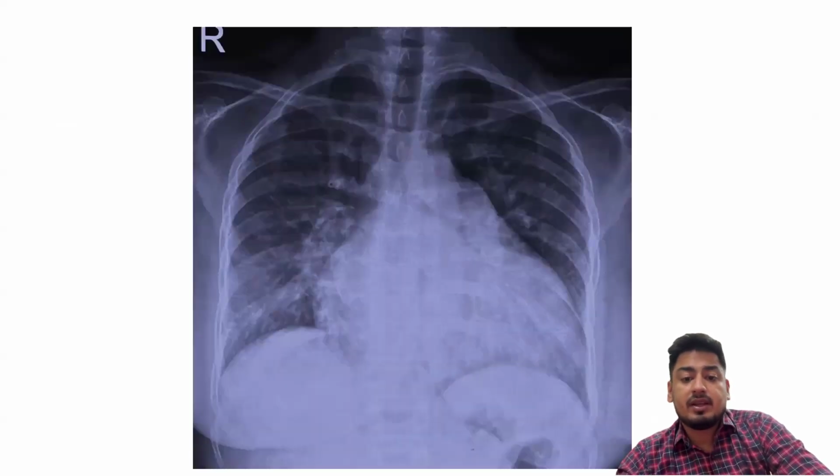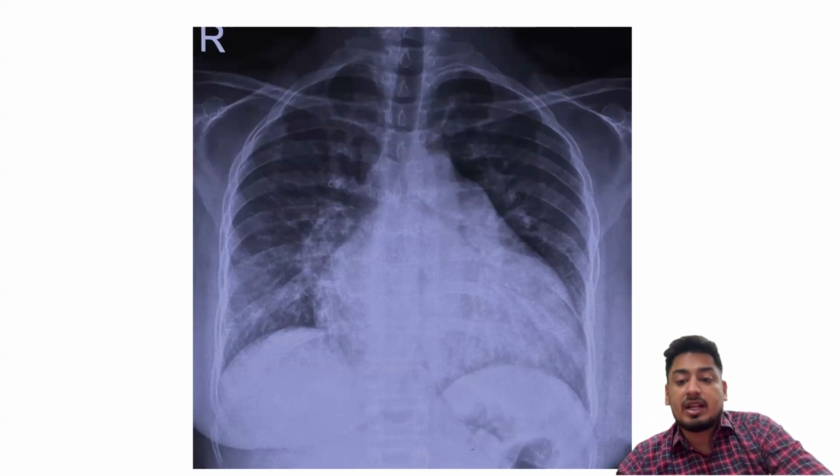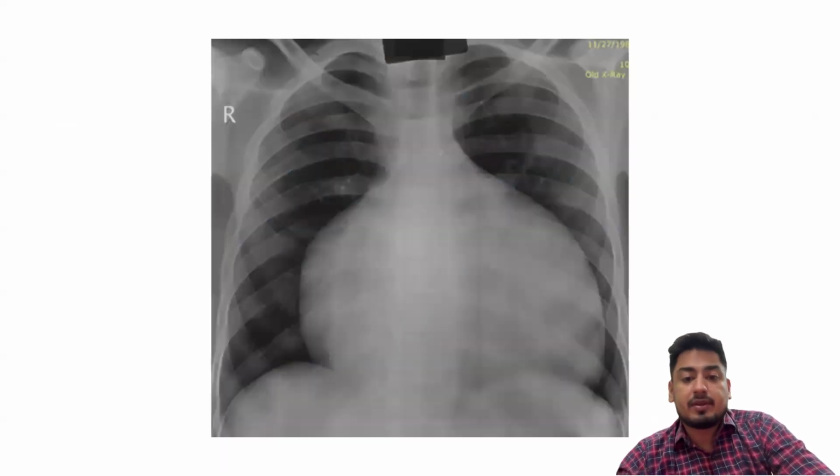Now in this X-ray, you can see the cardiomegaly is there. The carinal angle is more than 70 degrees. So LA enlargement is also there, as you can see on the left side as well. So the LA appendage is enlarged, LA is enlarged, and also there is cardiomegaly and the apex is of LV type. So this type of X-ray can be found in a patient of mitral regurgitation, because LA enlargement will be there, LV enlargement will be there. Now this is another X-ray.